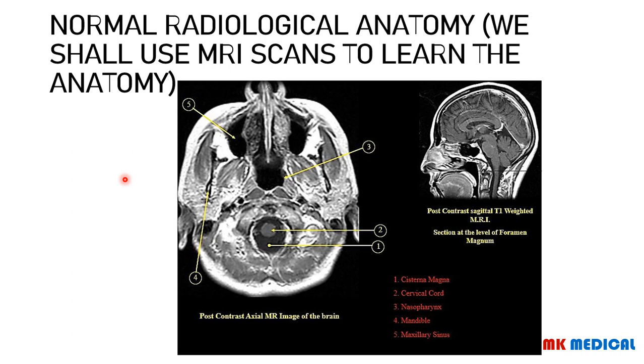So this is just some anatomy. I decided to add MRI scans here for us to learn the anatomy, so that when we look at the CT scans, as we carry on to do the pathologies, it will be a whole lot easier for you to understand. So don't say, oh no, why are we doing MRIs when it's a CT scan lecture? This is only to teach you the anatomy.